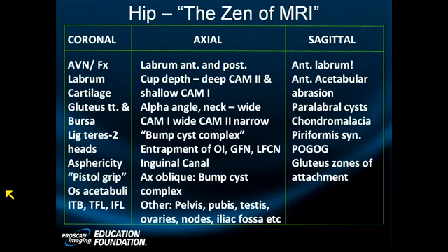Actually, I'll draw it this way. So our sulcus earlier was slightly triangular and had a conical top to it. But it didn't go very deep into the labrum, and it certainly didn't go through the labrum.